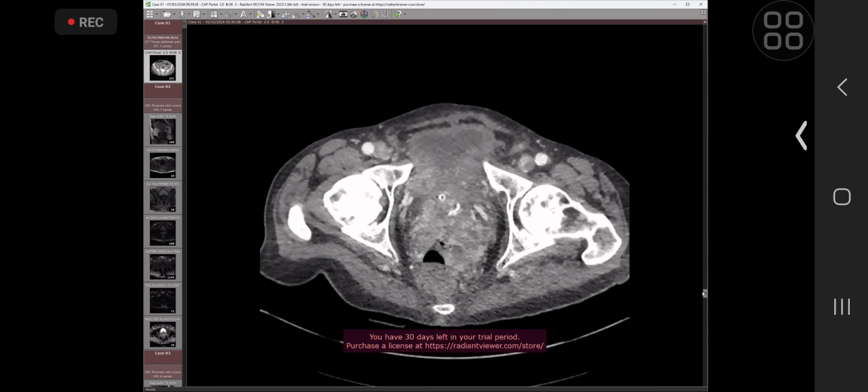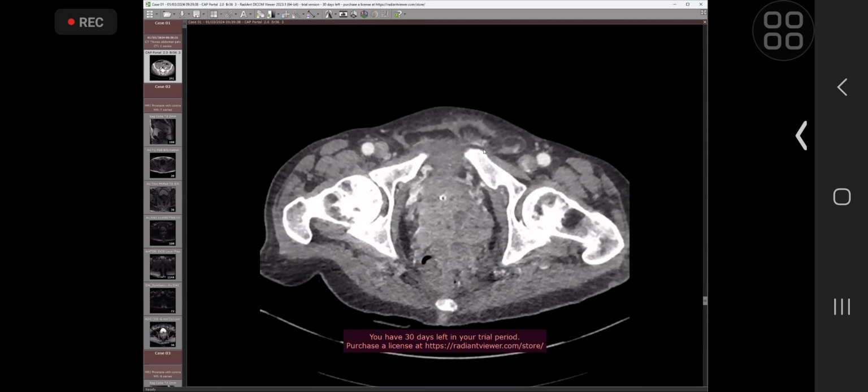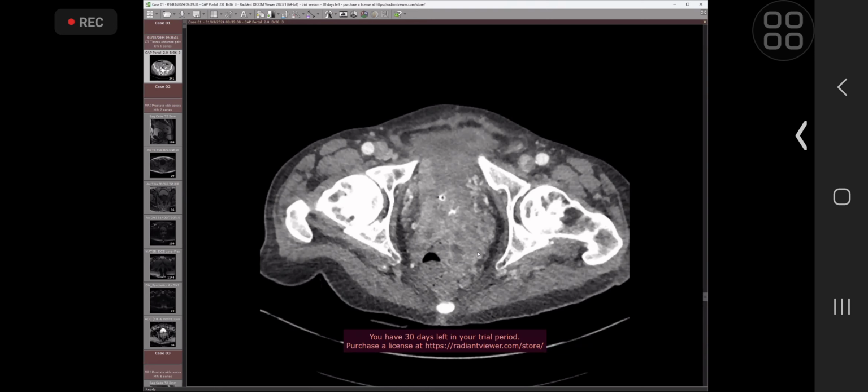Okay. So in the rectum there is abnormal invasion, or there is a rectal tumor involving the anterior, and I believe this is a mid and low rectal tumor. Although I would confirm that on the sagittal image or MRI dedicated study for the rectal protocol to further evaluate the lesion, if it's primarily involving the rectum or originating from the prostate, and the involvement of the Denonvilliers fascia between the prostate and the rectum as well.